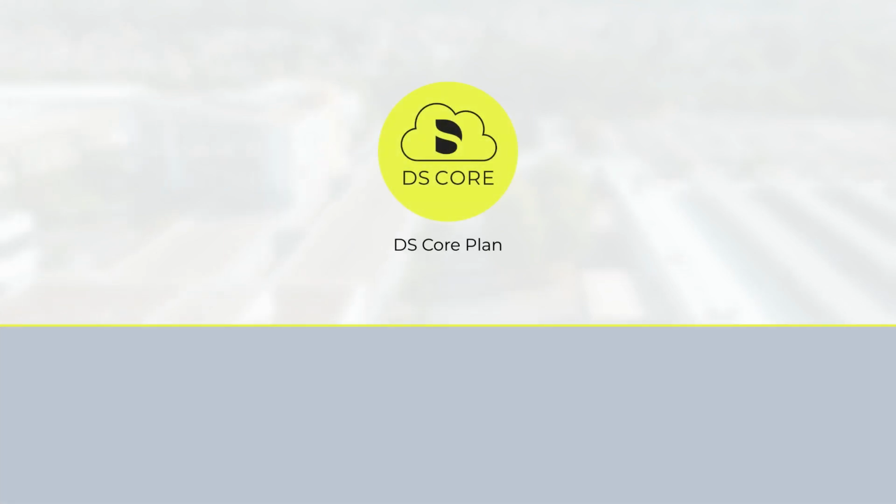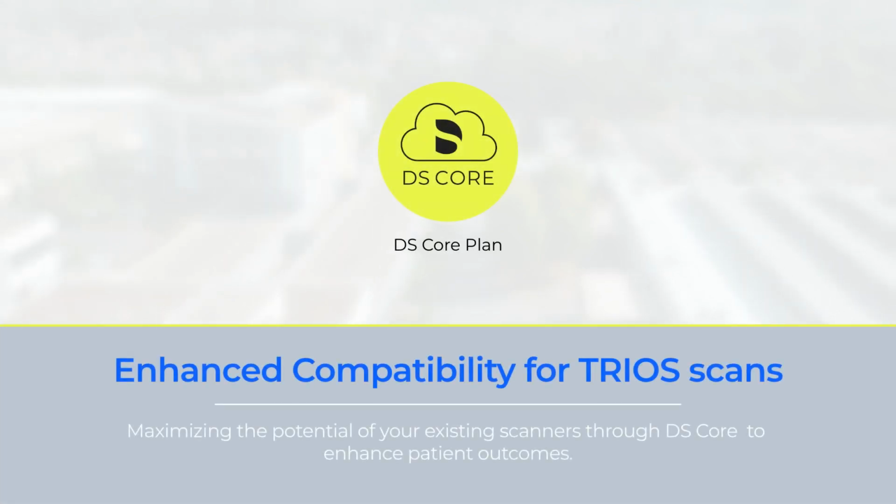In this tutorial, you will learn about the extended patient communication possibilities for Trios users with DS Core.